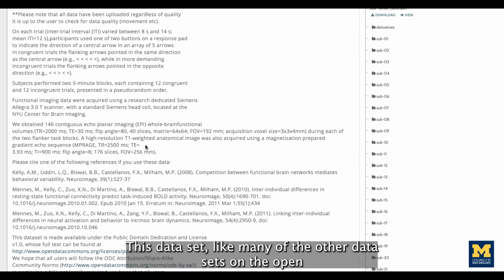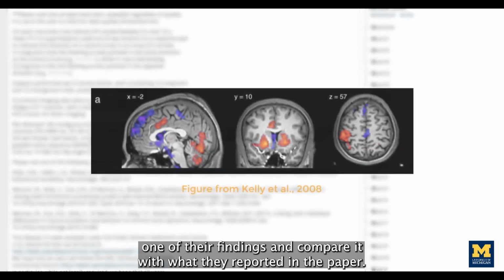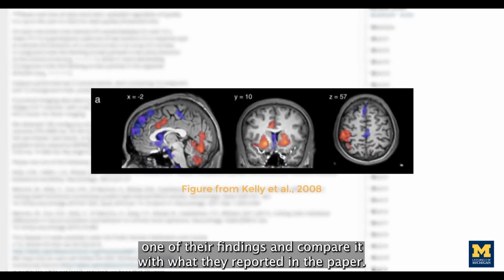You will see a README summary of the experiment and data parameters, such as the sampling rate and image dimensions. This dataset, like many of the other datasets on the Open Neuro website, has already been analyzed and published. One of our goals in this course is to replicate one of their findings and compare it with what they reported in the paper.